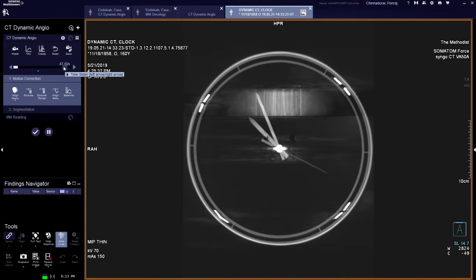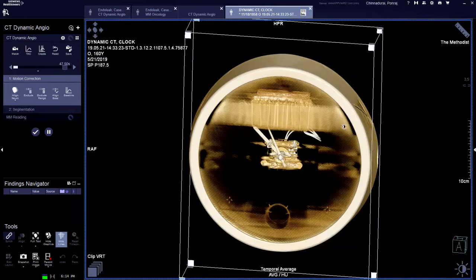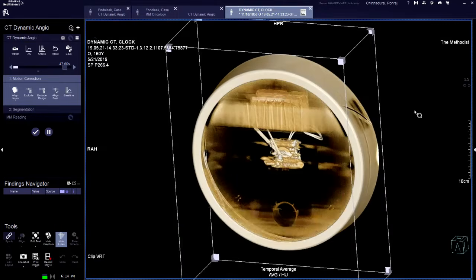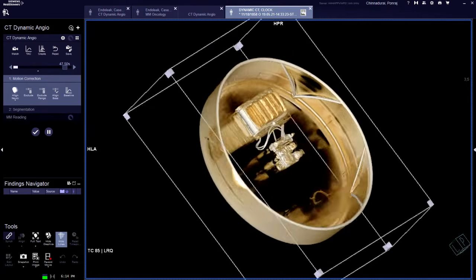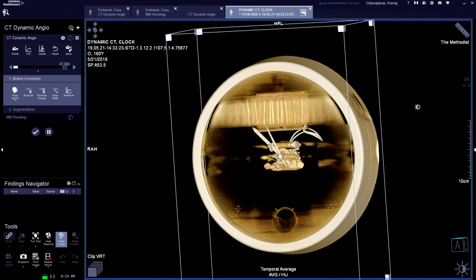So instead of the clock, think of the aneurysm and the endograft. Exactly. Okay. And this is not a 2D picture, this is a 3D volume, as you can see. I can rotate around and see the entire clock, right? You can even see the batteries of the clock and the mechanics of it, right? So it could be a great topic for a mechanical engineer.